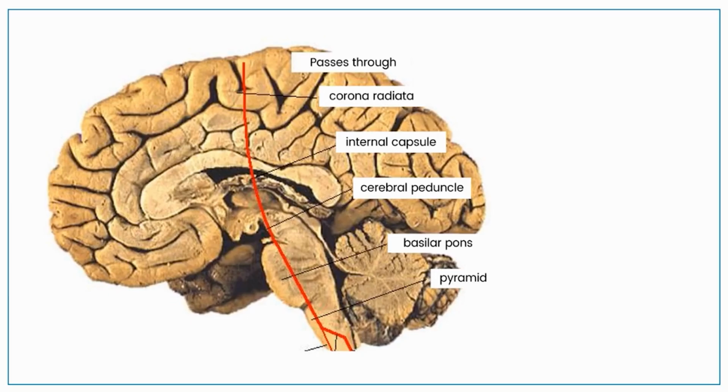Broadly speaking, we know you have the cerebrum, cerebellum, and brainstem as the core parts of the brain. If you remember, I told you that when you do a CT scan of the brain, the scan is done below upwards. That means you are going to see the brainstem first.